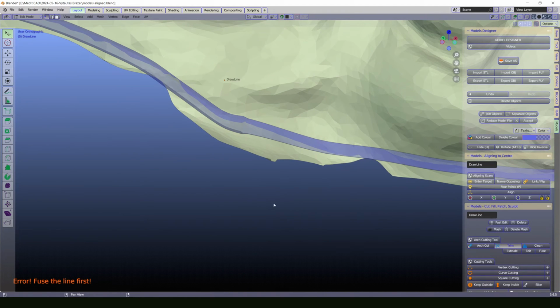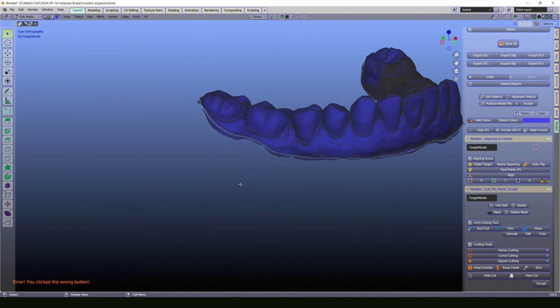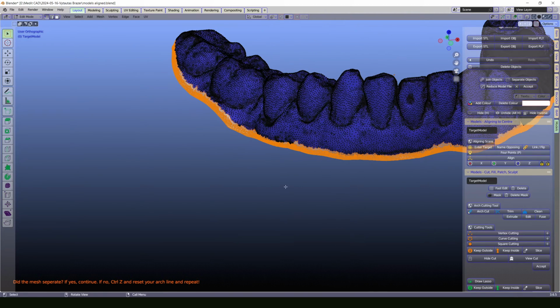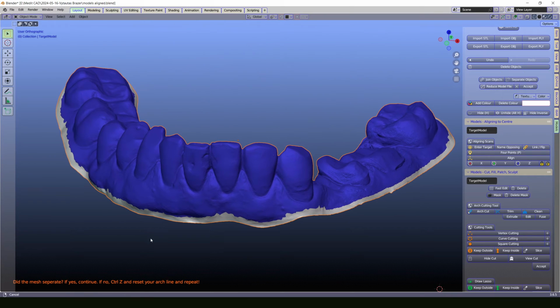And now we push the trim. Let's give some time for the calculation to happen, and we will see if we got a right calculation and a good result. So yep, now just click on the mover model, select on vertex and clean. Wow, it looks amazing. Just look at that. Great model.